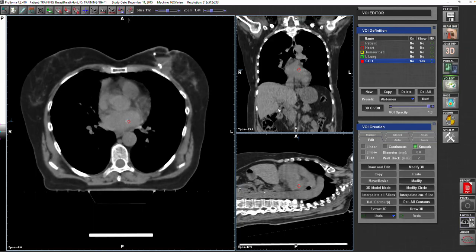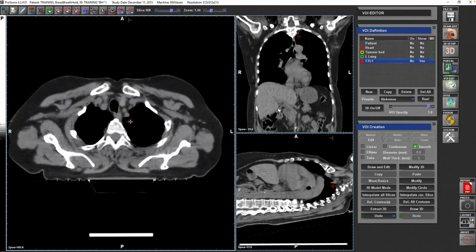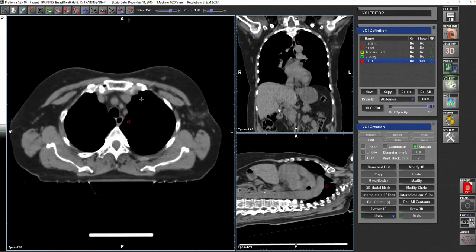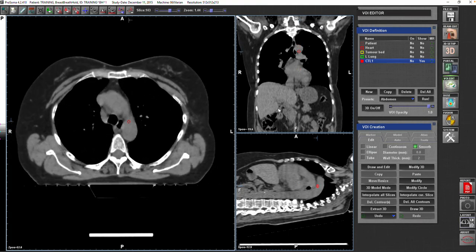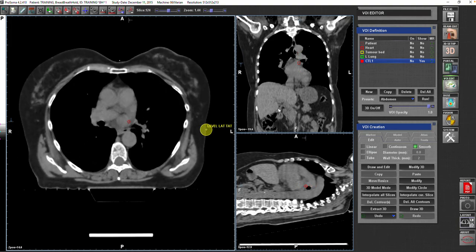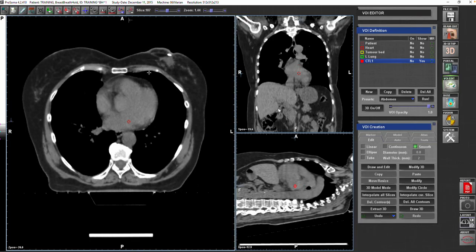There is another way of doing things. Some are counting the ribs one by one. So for example, if this is the first rib going to the sternum, then the coming rib will be the second rib joining the sternum, and then this will be the third rib joining the sternum, and this will be the fourth rib joining the sternum, as if you're counting one by one.